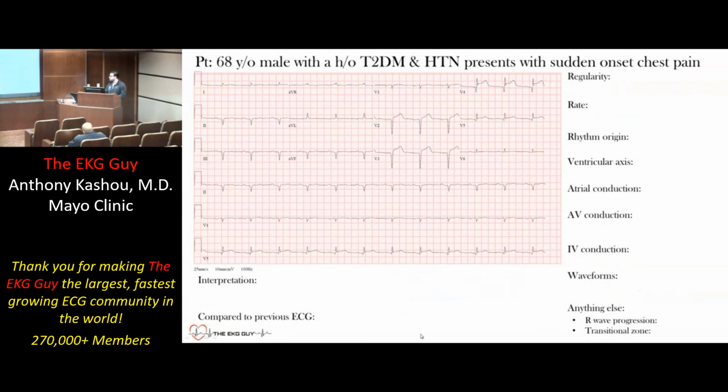Does this seem like a regular or irregular rhythm? Regular. Regular. Okay, so does everyone see that? This is a regular rhythm. Okay, does that make sense? So remember, one R wave to the next. You can use any interval, and all these are the same if you measure this out, right? With your calipers or the paper, you can see that these are regular R to R intervals. So we call this a regular rhythm. Very good.